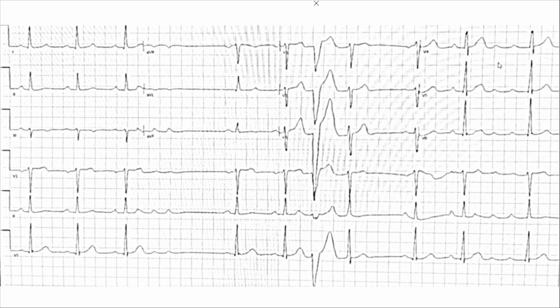Okie dokie. So let's reestablish what we know so far. We know that we have atrial flutter. It's intermittent. It comes and goes, right? It's there for a few. This person might feel this as quivering and a kind of a hollow feeling. I wouldn't be surprised if they mentioned something like that. What else do we know? We know that this is a PVC. We don't know what this is, so let's take a look at this.